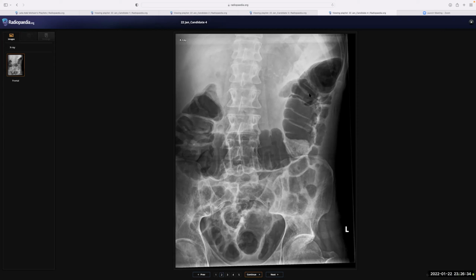Do you think the position of the transverse colon here is okay? No, that transverse colon should have been a little up. So this is as if it is pushed down by any space occupying lesion. Mm-hmm. So yeah, if I see carefully, I can see that the region near around the upper abdomen is not showing any bowel markings, so there can be any space occupying lesion in that region, and I should investigate further with a cross-sectional imaging to look at that region more specifically. Okay. Which cross-sectional imaging would you do?